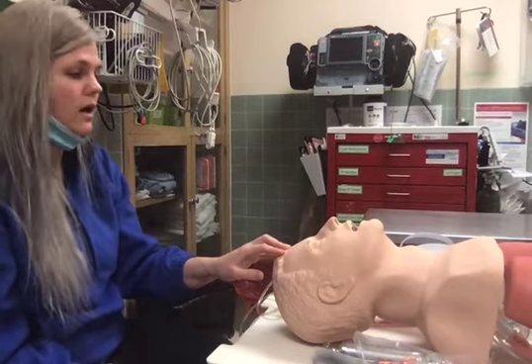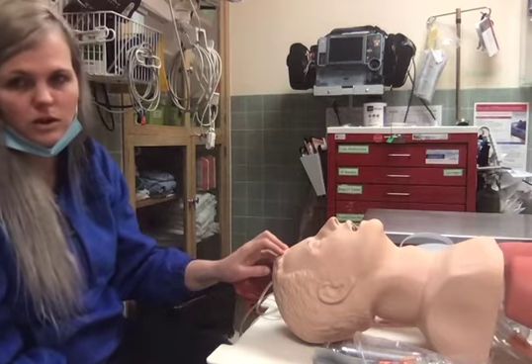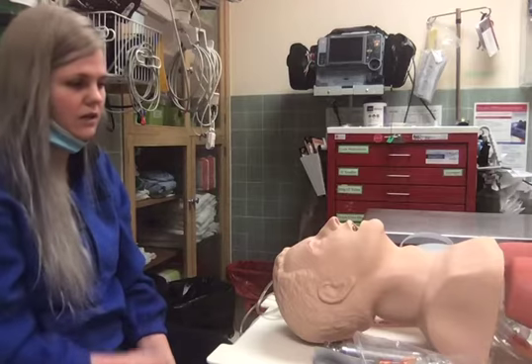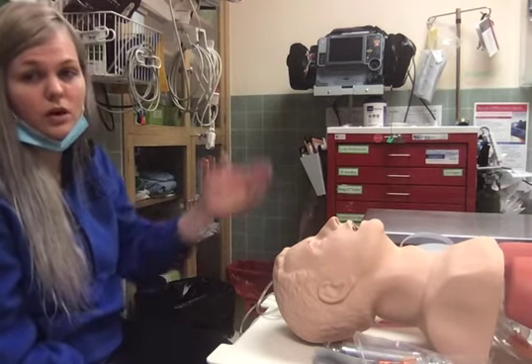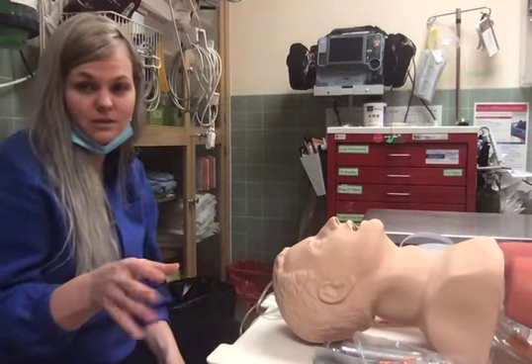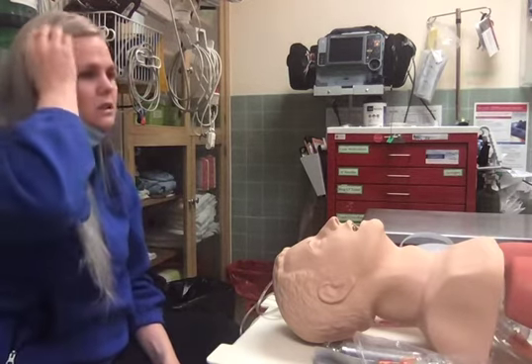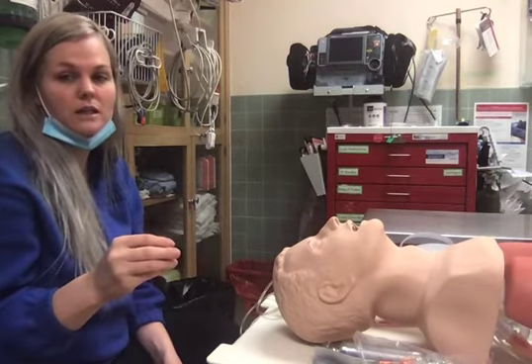And so this is a little bit different in the way that you set this up. You're going to set up your initial PEEP. So again, based on your patient presentation, generally starting at 5-6, give or take, and then you're going to set your pressure support on top of that. So essentially you are setting your PIPs or your plateau pressures at times. Again, you want to keep those below 30, but at the same time, this method is monitored by tidal volume.